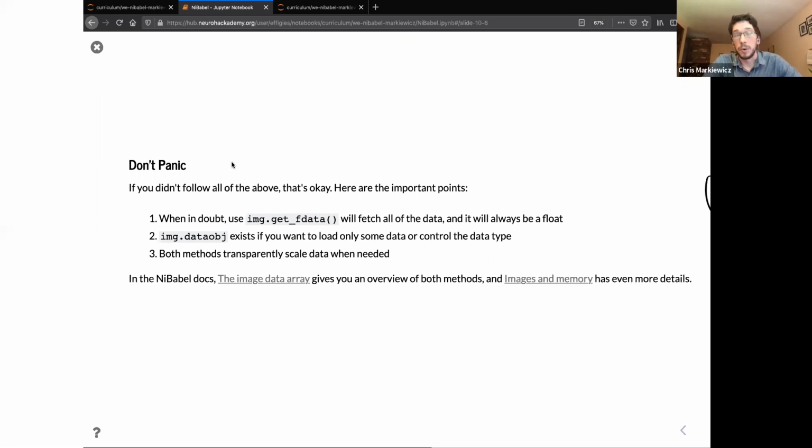Now, you don't have to. Floating points will save perfectly fine, but I would say in most cases you don't care about and shouldn't trust those extra bits, so any precision that gets lopped off should be considered not problematic. But this is obviously going to depend on use case, so you also shouldn't take that as a 100% all-the-time answer.